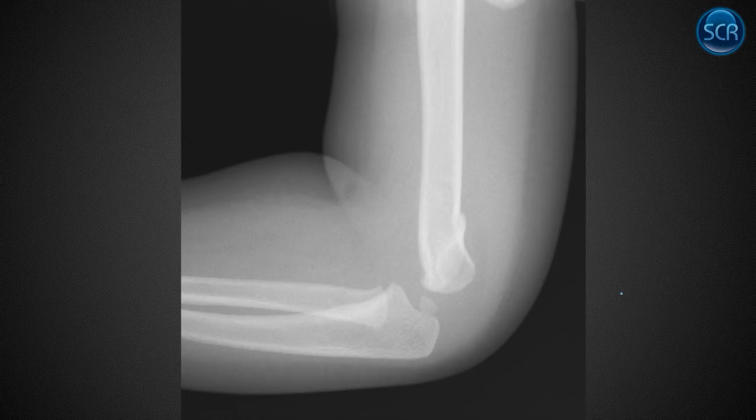This is a young child's elbow. They've only managed to ossify their capitellum, so they're very young. But they have elbow pain. We don't really see a sail sign in this case. Not the best radiograph, but when we have a child with elbow pain, we're worried about a couple of common things.